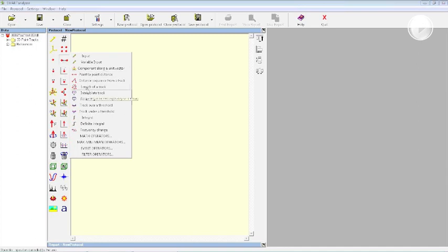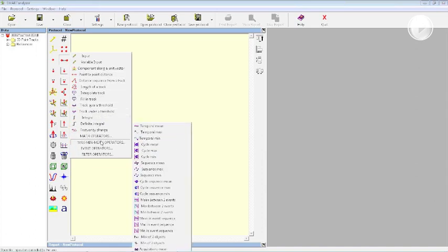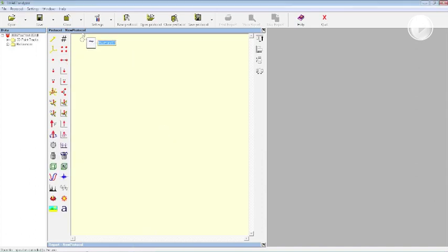Okay. I want just to show you one simple tool just to show you how they work usually. I have one or more input and always one output. In this case, I select a tool that allowed me to create the temporal mean of an object track.